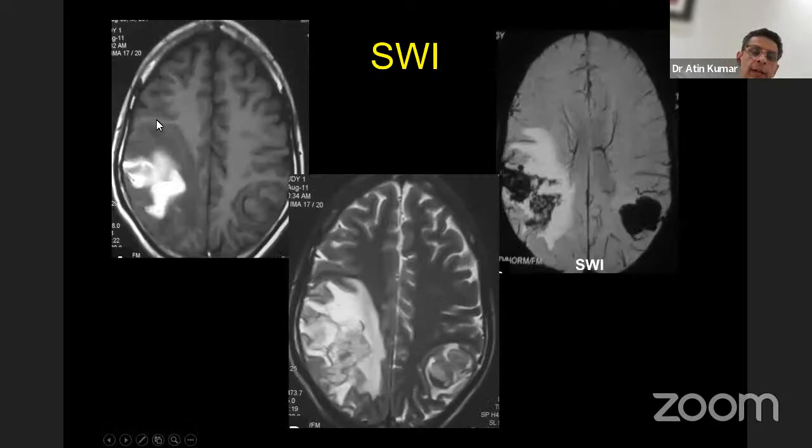Also, let's look at this particular section. I'm sorry, but this does not contain the ventricle, but still you can identify it as a T1 weighted image. This is not in a small child, in a neonate. It is in a myelinated white matter. The white matter is bright, but the CSF is dark. In the sulcal spaces, the CSF is dark. This is a T1 weighted image.